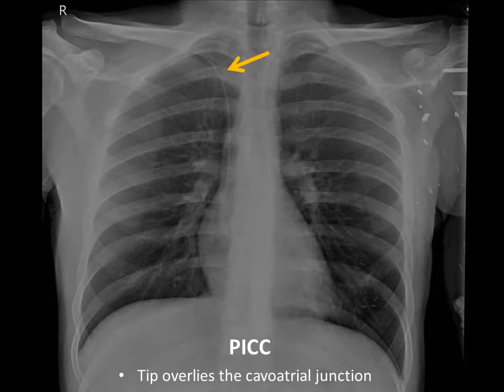Similar things you'd be looking for on a PIC. You just want to make sure that it's in the right place. You know what the line is. You don't see any iatrogenic processes.